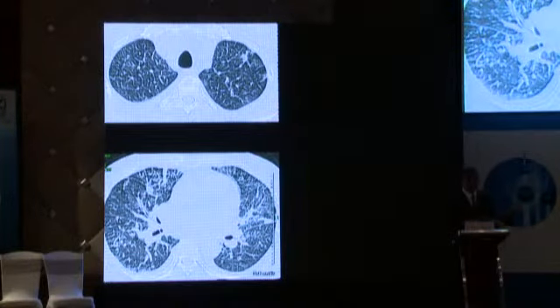Septal thickening is thickening of the interlobular septae, and we saw that as one of the ways in which you can then identify the secondary pulmonary lobules. The septae contain connective tissue, lymphatics, and veins, and therefore you can get septal thickening with interstitial lung diseases, with fluid, with lymph, and with cells. Typically, if we get septal thickening in the upper lobes and we get bilateral pleural effusions, this tells us that the patient has volume overload, and this typically happens with left-sided failure.